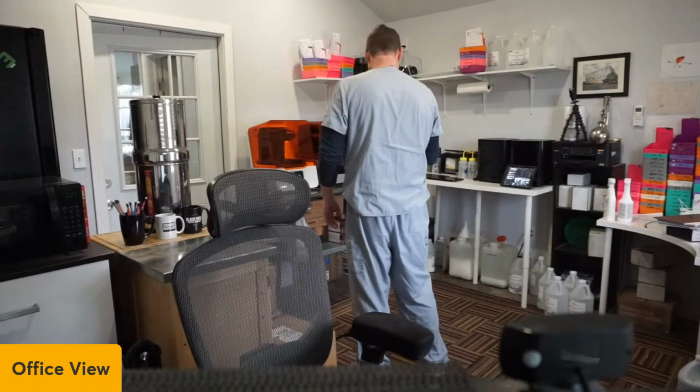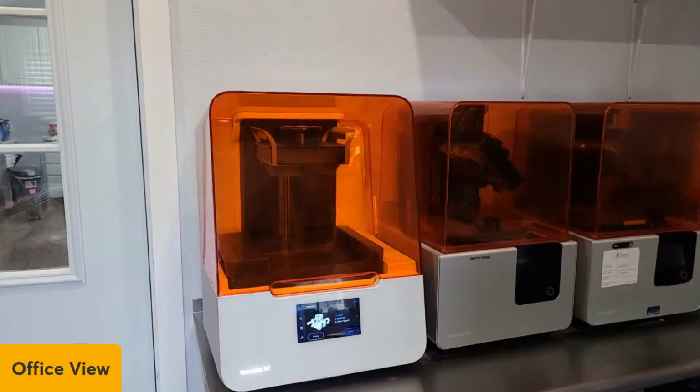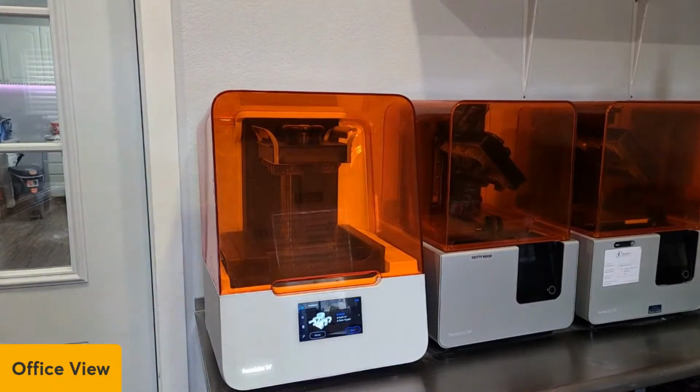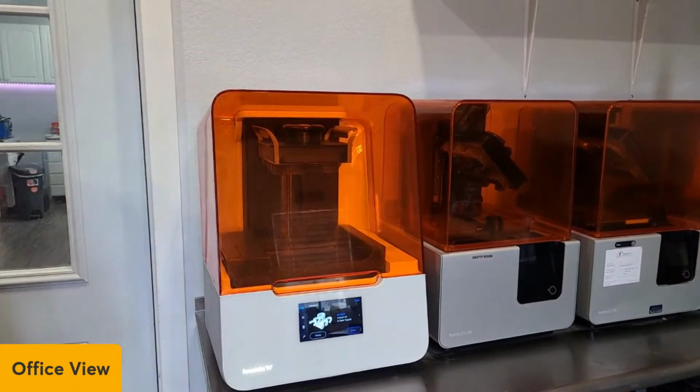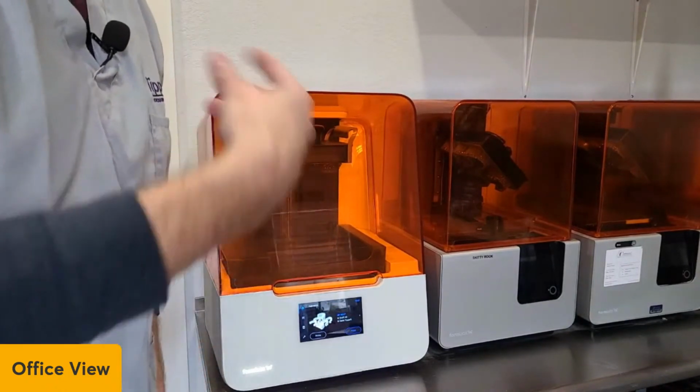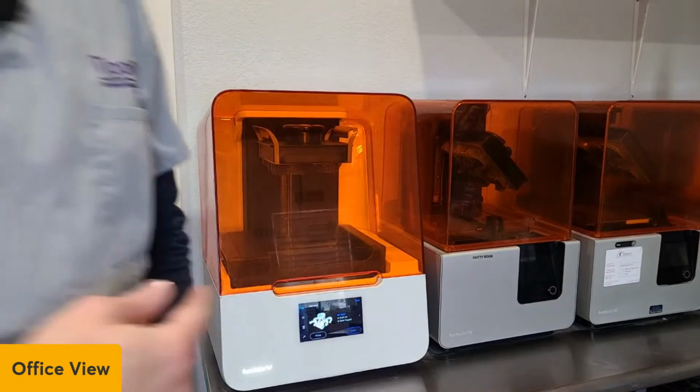Okay, so let me change that. Am I on the right screen? Yeah. All right. So this is my Form 3. This is the one we sent that print to, and you can probably actually hear the fans going. It's starting to heat up and do its thing.